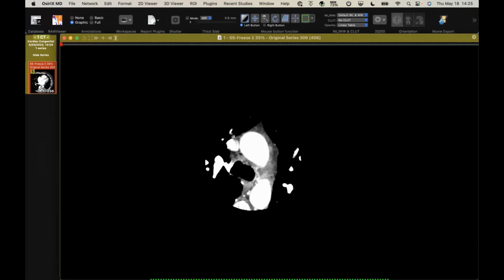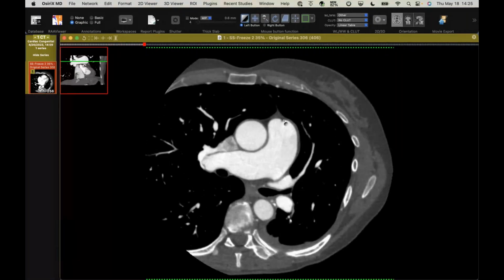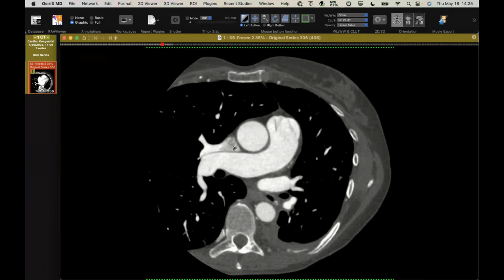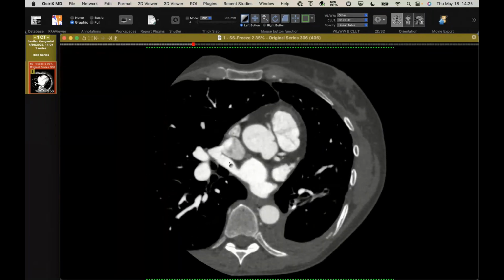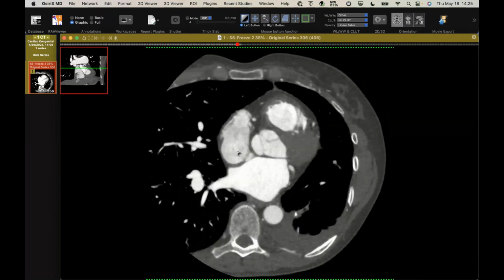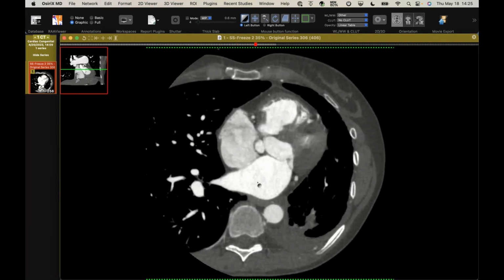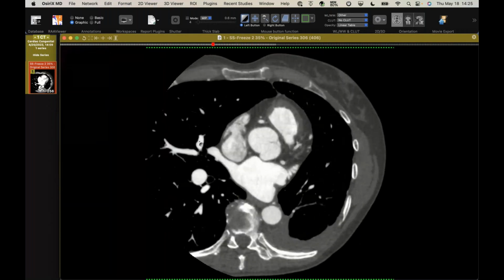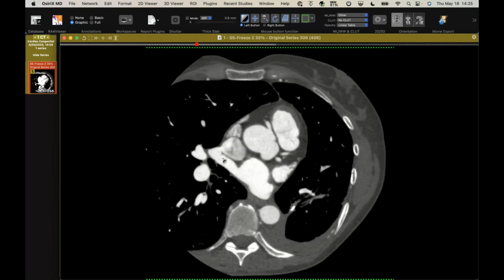This is a 46-year-old who also has a shunt, and this was a coronary CT, but it shows it better. You can see we have a pulmonary vein coming into the SVC right here, just anterior to the pulmonary artery. And the SVC itself goes into the right atrium, and you'll see that the right atrium and the left atrium are separate. We have slightly different mixing contrast. We don't see a jet going across either way. But what we do see is a communication with the same vein that's draining into the SVC. It also drains into the left atrium.